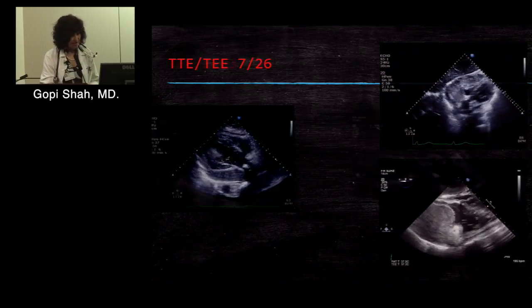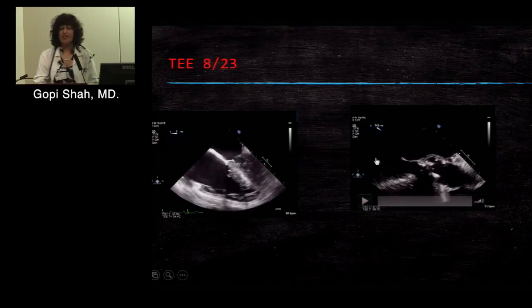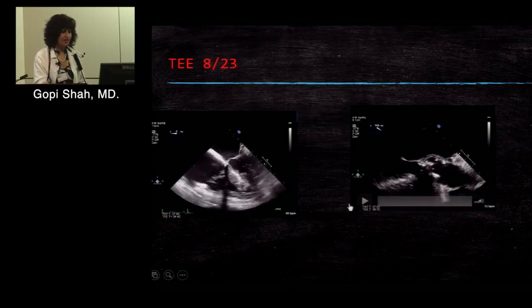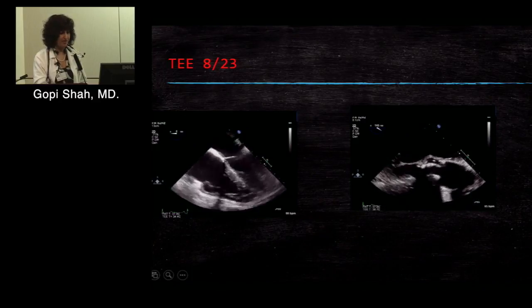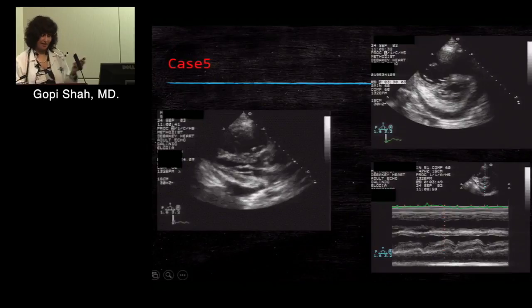Patient was emergently taken to the OR and evacuated, and this is what you see now. This patient actually had dehiscence of his aortic valve sutures and bled into the pericardium. They cleaned it up, they resutured it, and he still has what looks like to me like a vegetation, but his course was good, complete recovery. So this is when you'll say, oh, patient has had an echo, why are we doing it again? Well, that's the reason.